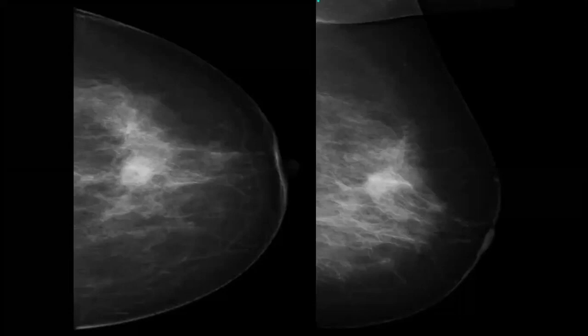We said localize the lesion by laterality, by quadrant, and the depth. At the middle part of the breast, the middle depth, yes, you are right. No associated features. At what o'clock? 2 o'clock. Clock position. Yes.